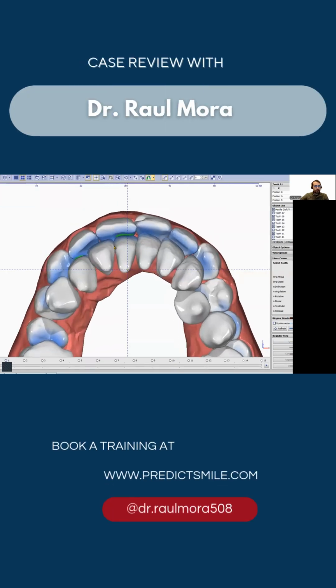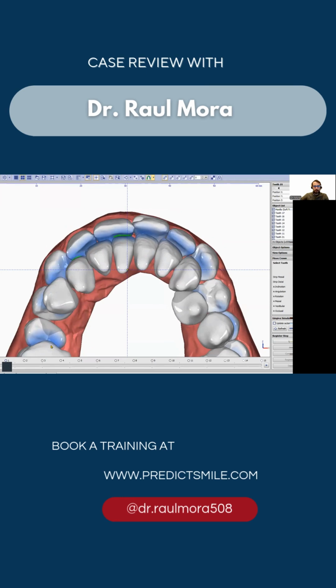Hello, so today we're going to see how I'm going to solve this anterior crowding. It's not a complex case, it's very moderate, but I'm going to show you the way I will develop the staging. So let's start the case.